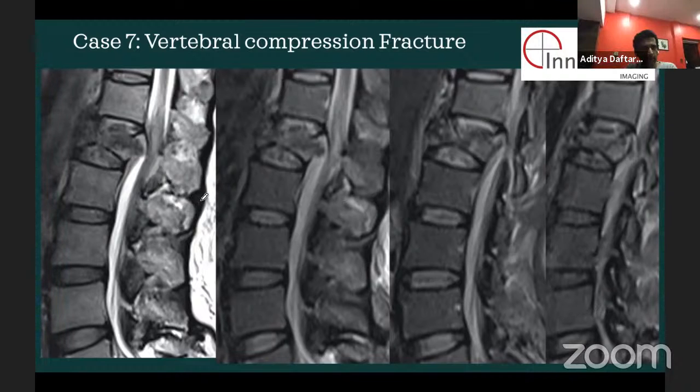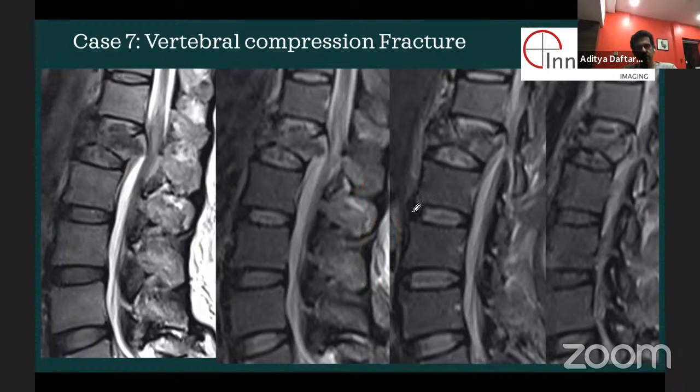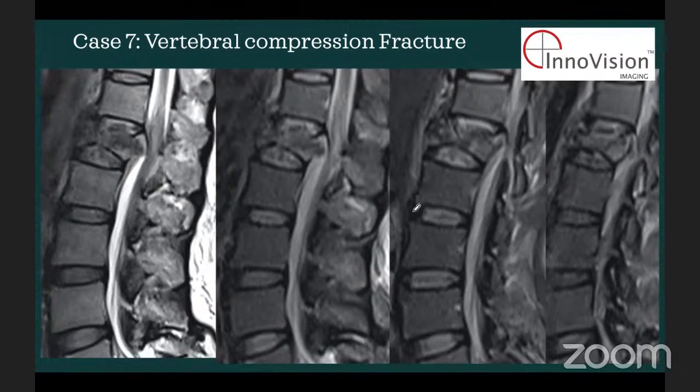So you're talking about what changes here? This stuff? Or this stuff here? Circle or arrow? Arrow, sir. Okay, fine. All right. Anything else you'd like to say about this? Anything else you see? Why the other images are given? No.